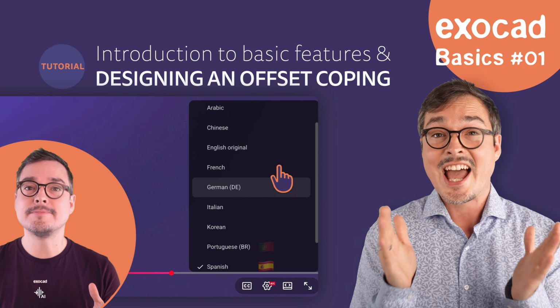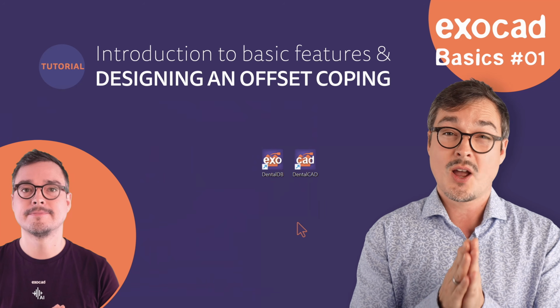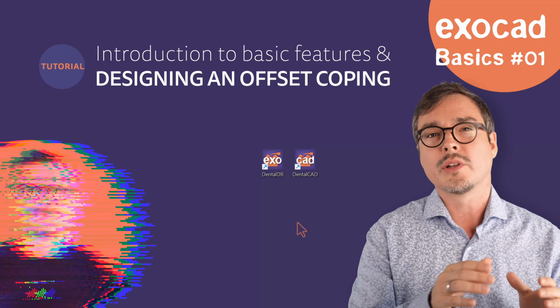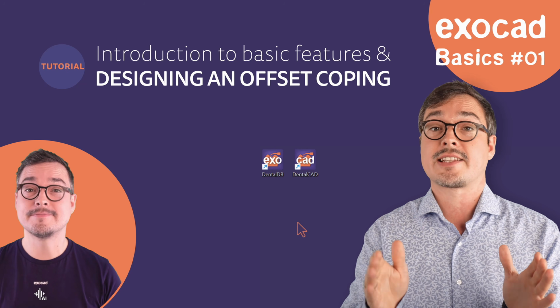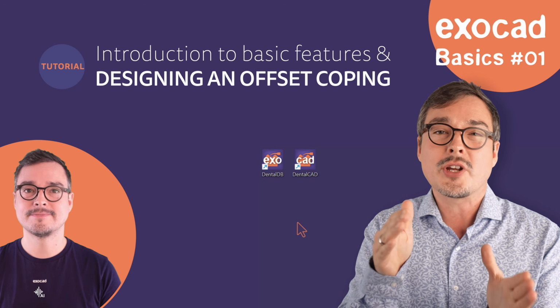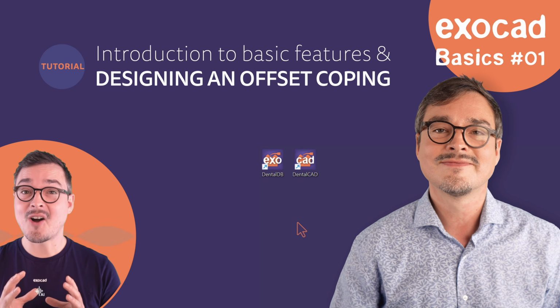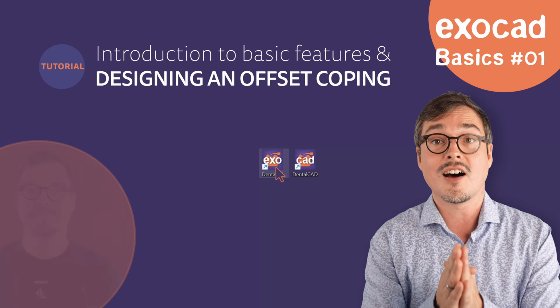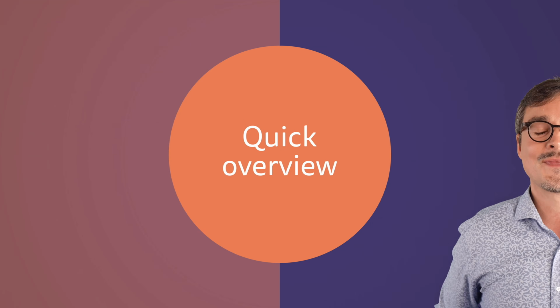With all that said, let's start our new basic series with a quick overview. You could do that. And then we will take time for detailed step-by-step instructions. In upcoming tutorials, we will dive a bit deeper each time. Are you ready? Oh yes, now I'm getting excited. Great. Then let's get started by launching the DentalDB together.